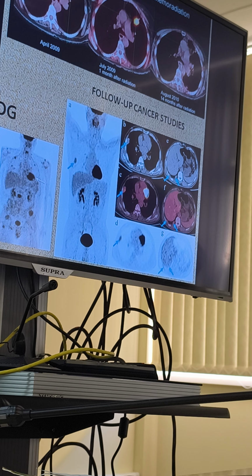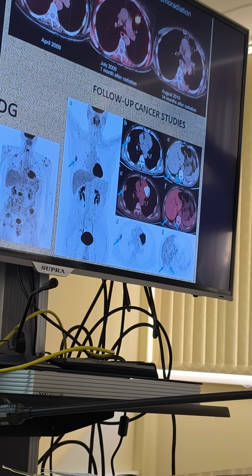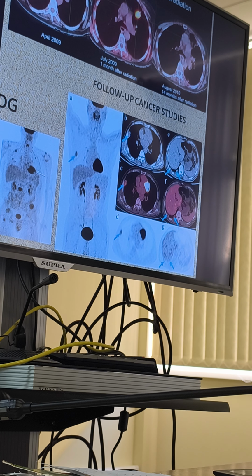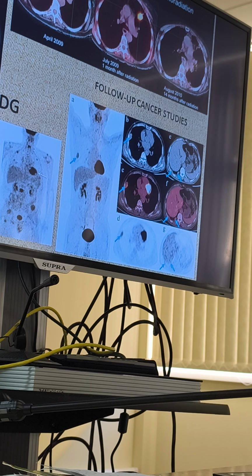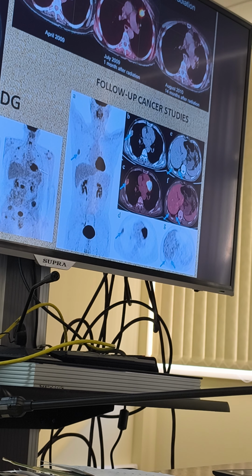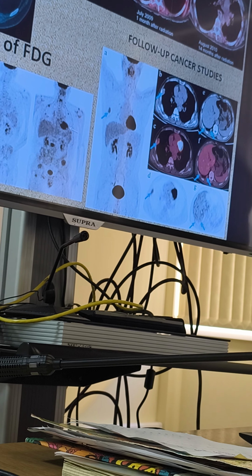And at the last picture, it's small in size with new structure because they see a cyst and fibrous tissue and no uptake. That again means they still have some remnants here, and that's okay with tumors, especially after severe treatment. They still have some volume, some tissue, but this tissue doesn't have live tumor cells, and so that means we can stop this severe treatment. So that's why it looks so good in this situation.